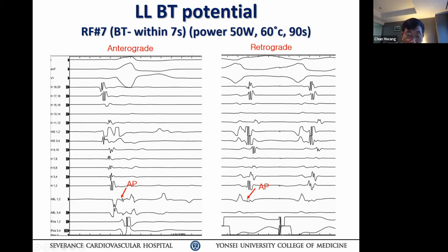So the pathway is specific for each electrophysiologic pattern of activation. You need to block the interseptal pathway, leaving only conduction to the left lateral pathway, record, then you're able to record a pathway potential and confirm it. Again, in my eye, it may be pointing just to early retrograde A. That's possible. Okay. Anyway, we'll talk about that later. Let's go. Okay, then what did you do?